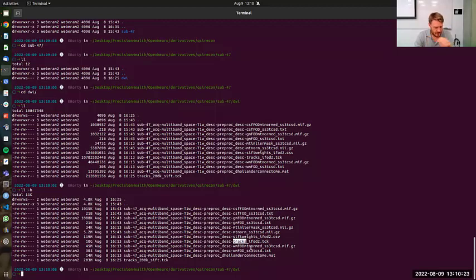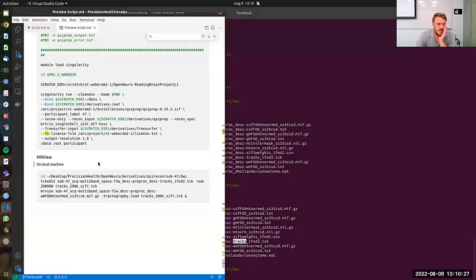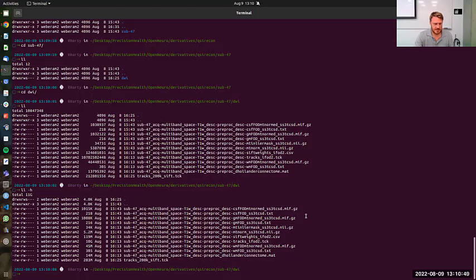And so what I ended up doing after I brought it over to my computer is I edited it because it might be too many fiber tracks to actually visually look at. So I reduced it to 200,000. And then I ran MRView, which I think is an MRtrix software package.